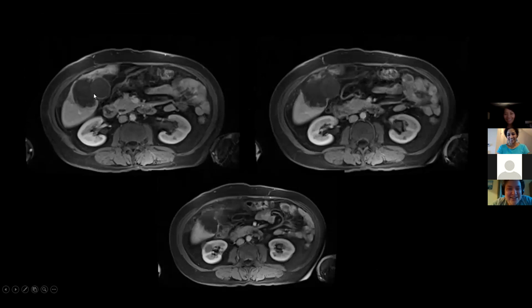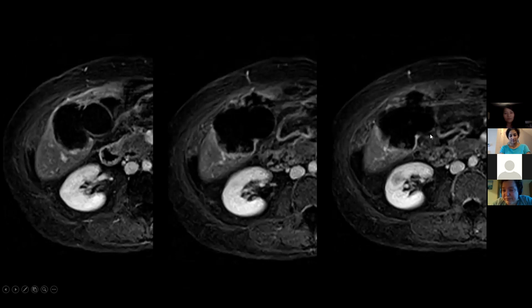Okay, just a second. So here's the wall of the gallbladder, so nicely enhanced. And here you kind of don't see the enhancement, which made me personally more suspicious of a rupturing gallbladder and basically having all this abscess into the adjacent liver. If you look through, this is not enhancing, but there are all those bits and pieces of adjacent liver that are still enhancing, but could this be just an abscess? Certainly could.